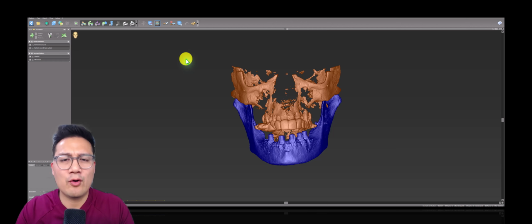This is the post-op CT scans. You can see this is a lowercase mandibular case. And you can see those healing caps are radiopaque, and those are screwed onto the multi-unit abutments. And so what we want to do is take this scan, merge it to the original pre-op scan, and then use these healing caps to merge our tissue scan, our healing cap tissue scan from our Trios, our intraoral scanner, to this CT scan. And then from there, we can design our temporary.